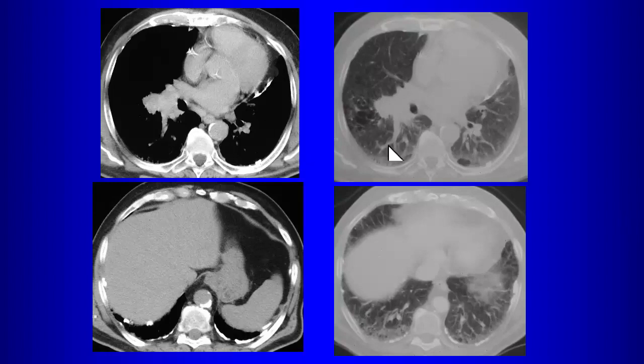Right, so there's a risk factor of emphysema; the patient has emphysema. Whenever we see emphysema on a CT scan, we know that that's a risk factor for lung cancer, so that increases our index of suspicion. Is there anything else? Anybody see another risk factor for lung cancer in this patient? Pleural calcification. Yes, there's pleural calcification, so what's the significance of that? Asbestos exposure, right. So these are asbestos-related pleural plaques, also increasing the risk factor for lung cancer, okay?